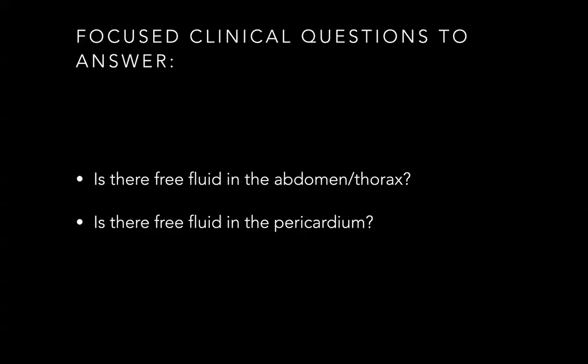So let's continue on. The focused clinical questions you want to answer for the FAST exam: is there free fluid in the abdomen, in the thorax, and is there free fluid in the pericardium?